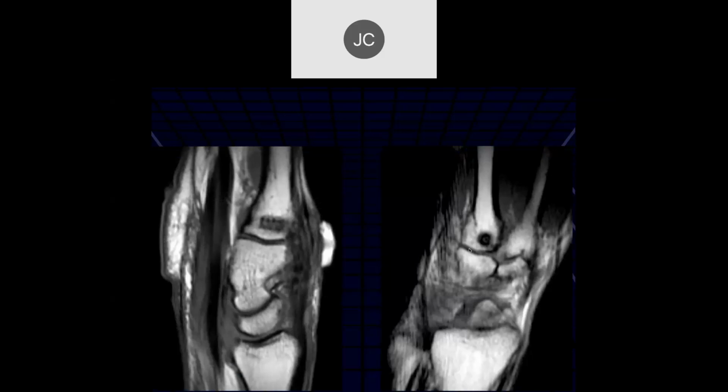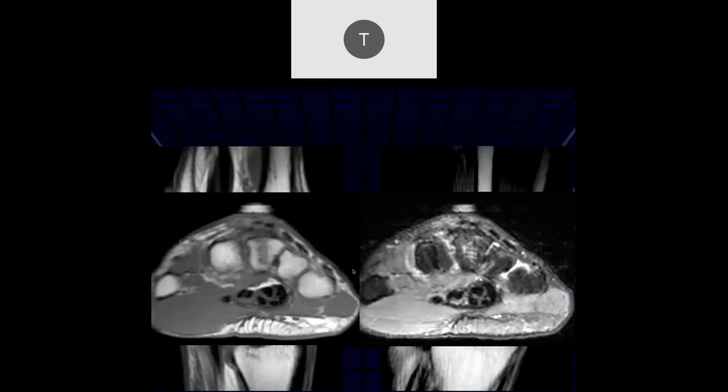All right, so it looks like there's a surgical tunnel there in the third, and there we can see the marker. What do you think is going on here? Guess that's been repaired. If we follow all the way back, this was the extensor pollicis longus. Now this was a tenodesis of the extensor pollicis longus into the third metacarpal base.